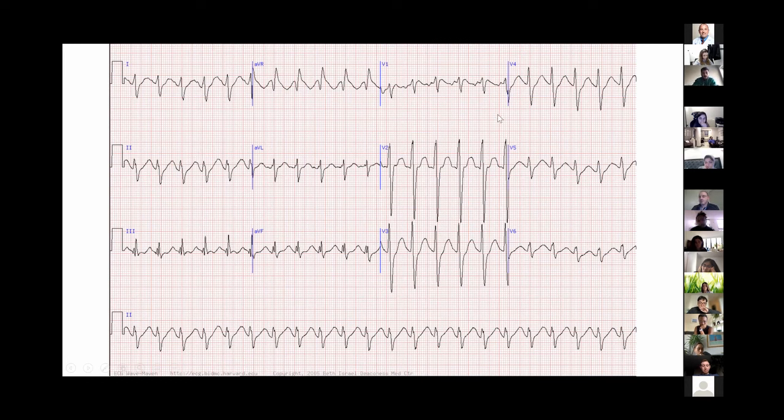This is kind of a pathognomonic EKG where you have wide QRS complex, but you clearly have P waves present in V1 as you saw. You see how it's helpful when you go through the algorithm and systematically look at the EKG, because the reason why you noted the P waves so well is because you were looking actively for AV dissociation.